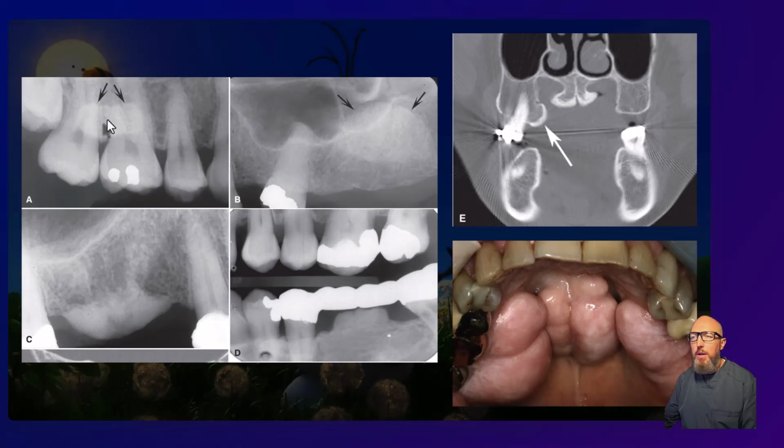What does it look like in periapical radiograph? Just like the other things, it's just the location. So just like the tori, but the location is a little bit different. So if I saw this, I would say it's likely going to be a buccal exostosis, though I can't tell necessarily that it's not a palatal exostosis. This one as well. What are we seeing over here? We're seeing some proliferation of bone right on the alveolar crest. And this one particularly, it's right underneath the pontics of a bridge. We call it subpontic hyperostosis. It's caused by pressure exerted by chewing on that bridge, and then the two pontics kind of get pressed together.